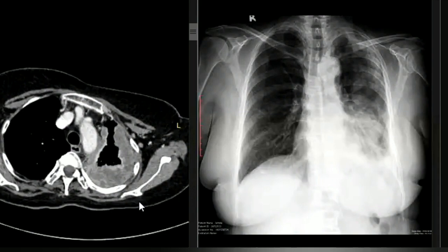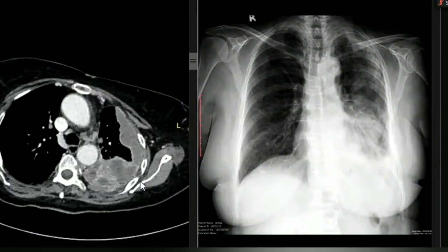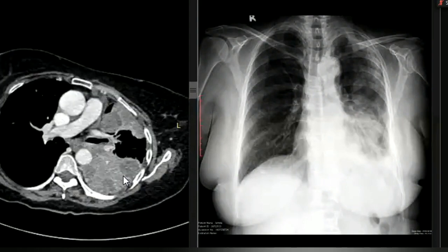So if these changes are not present on X-ray or on the lung, and instead you are looking at a pleural-based soft tissue mass encasing the entire lung with clearly reduced lung volume, your first differential would be mesothelioma or metastasis. Yes, I agree. At times, lung cancer invading the pleura can be in the differential, but not tuberculosis.